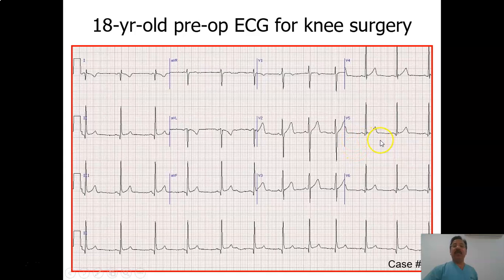Anything else interesting, miscellaneous? U wave, J wave. What about the lead misplacement? It looks like lead 1 and AVL look abnormal. So there is probably some problem where the lead has been misplaced.